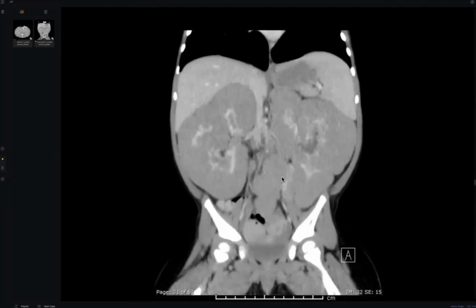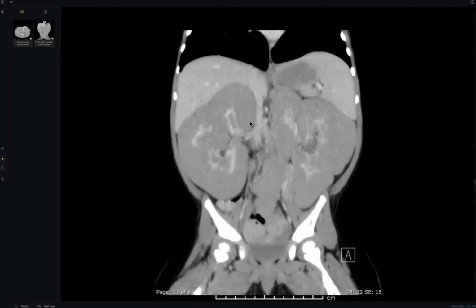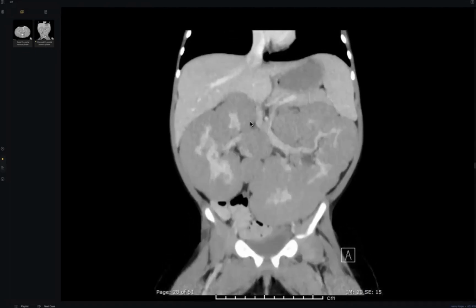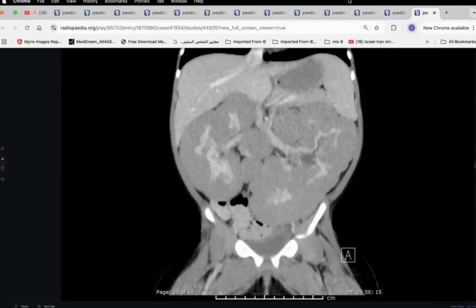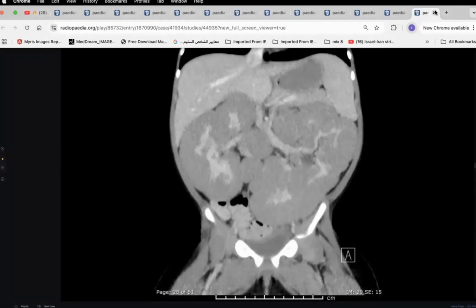The residual normal tissue enhances because it is post contrast, and all of this is non-enhanced blastemal cell. Why? Because it is embryonal cell, it is poorly vascular. It is highly malignant, with malignant transformation of about 40% to Wilms tumor.